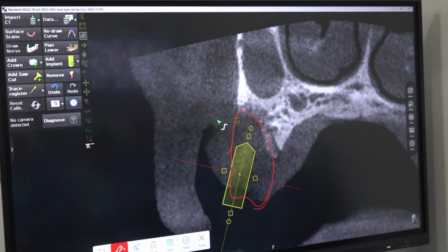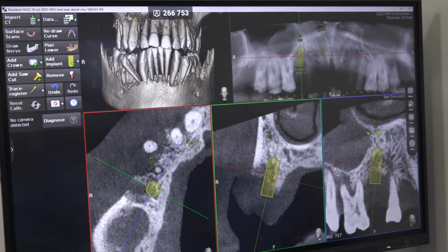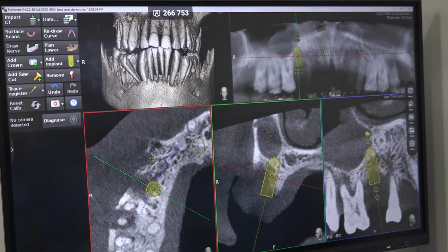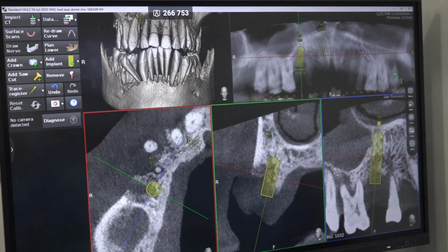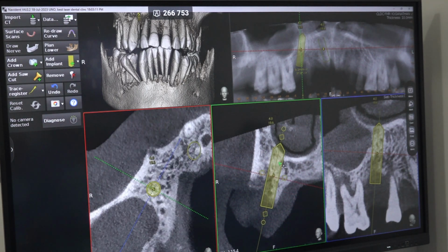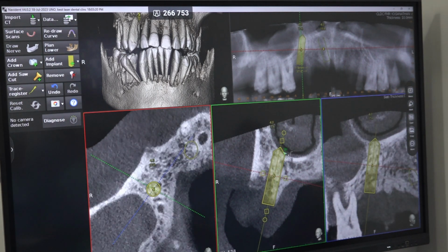So axially, 5 is not ideal, right? This is axial placement. But if you tilt slightly, similar to all-on-4, you easily get good bone. So this will be a good plan. So around a 4 by 16 implant.